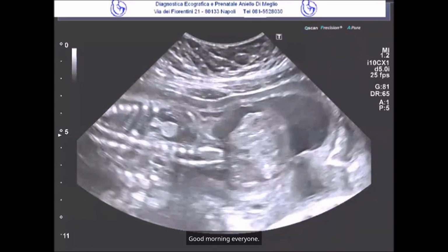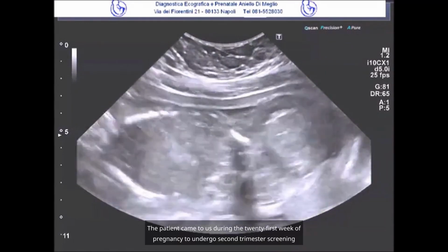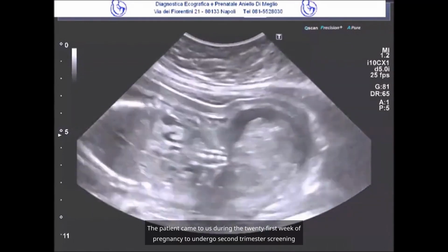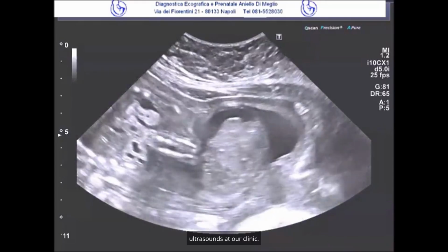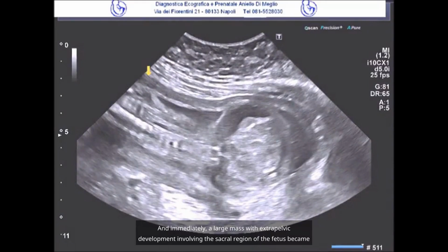Good morning, everyone. Today I am presenting a case of sacrococcygeal teratoma. The patient came to us during the 21st week of pregnancy to undergo second trimester screening ultrasounds at our clinic. And immediately, a large mass with extrapelvic development involving the sacral region of the fetus became evident.